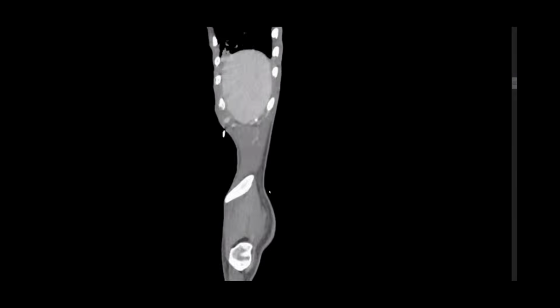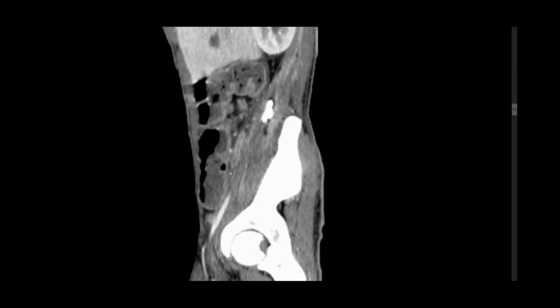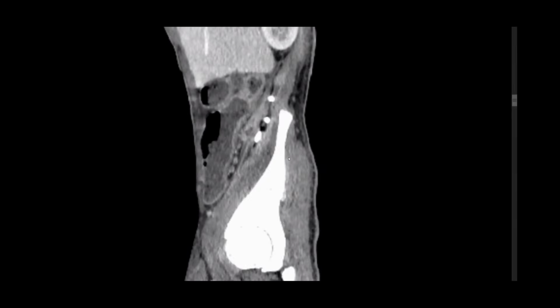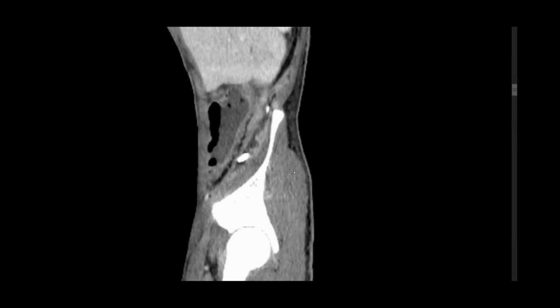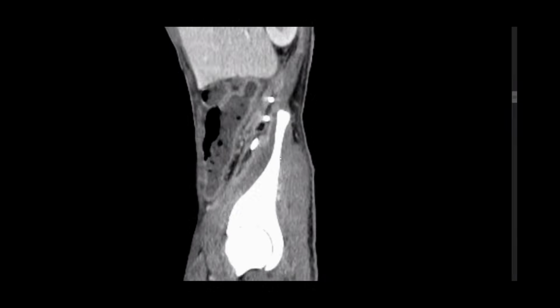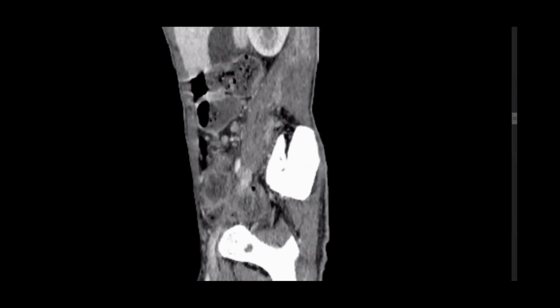Look at the sagittal plane. Look for the appendix. Here is the appendix. Yes, there is appendix there. Yeah, most probably this is appendicular tuberculosis infection with secondary psoas muscle abscess, because we have severe tuberculosis infection involving the appendix. Okay. Really, you are perfect, fantastic, candidate number 1.